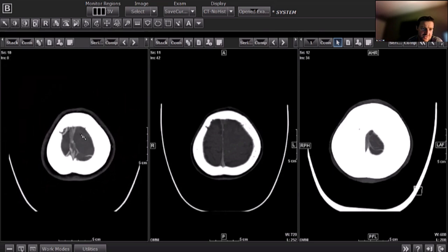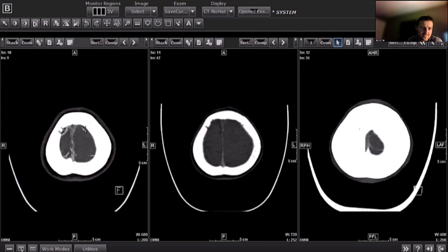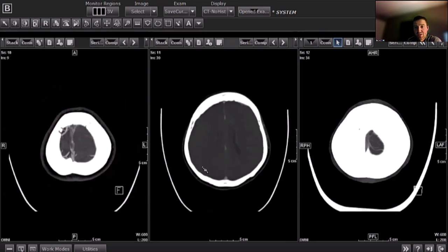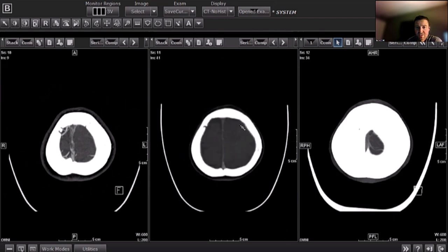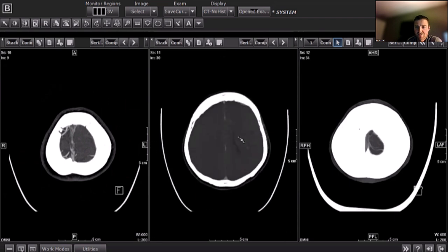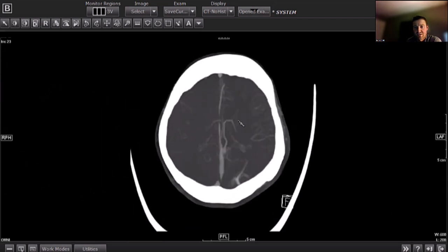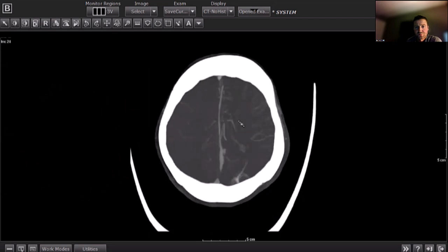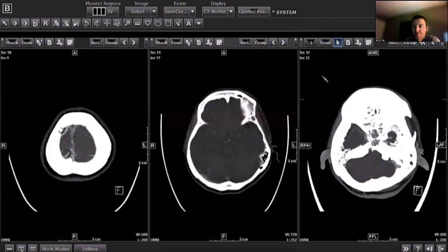so something's up. Then you come to the vertex and you realize that the superior sagittal sinus has a large filling defect. There are cortical vein thrombi as well. So this is an area of venous ischemia. And this one can be a little bit strange on triphasic CTAs. You can actually see there's an increase in the number of vessels in the left frontal lobe. This is just secondary to basically venous hypertension, venous reflux. And again, it actually worsens on the second delayed phase. Just another reminder to always look at all the vessels and to remember about venous ischemia.